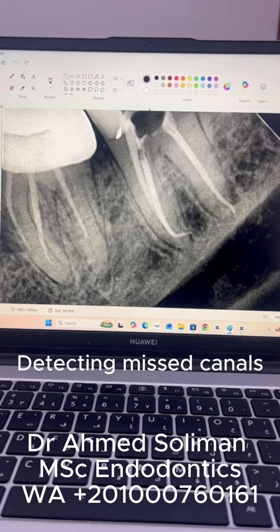Check that this is what happened when I finally obturated this tooth. Don't worry about this 90-degree curvature; we are going to talk about it in another video. As you can see, this canal is opening laterally. So if I measure from here to here and from here to here, it will give me different measurements, so I always measure from the middle third.